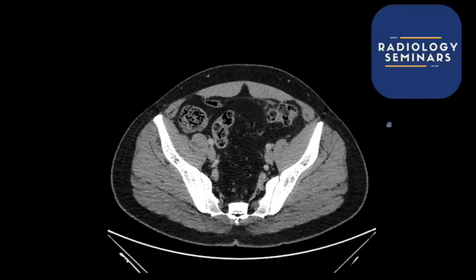to try and figure out what this is. So I'm going to keep it here. Hopefully people are, come on, let me see some answers. Keep going. Anyone seen it? Okay, look, first of all I'm going to say it's not diverticulitis, all right? It's not diverticulitis. I think that would have been a bit too easy.